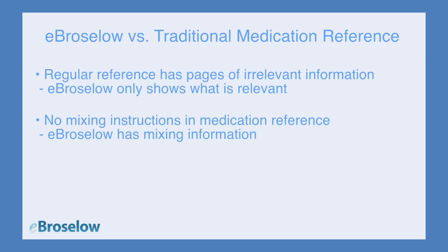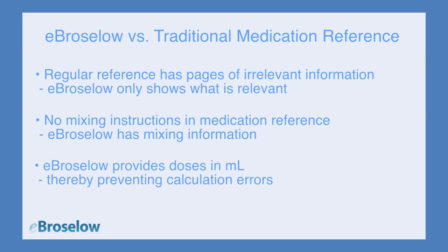In addition, instructions on mixing the medication are not located in the traditional reference. This would have required a phone call to pharmacy or potentially a third reference. And, as always, eBroselow does all the calculations in milliliters, thereby preventing calculation errors.